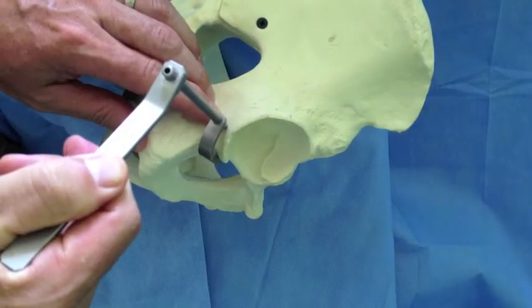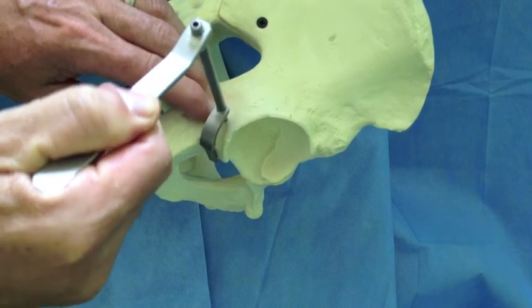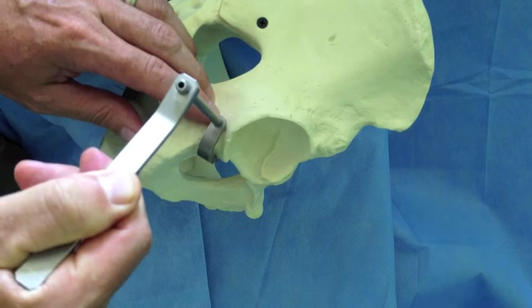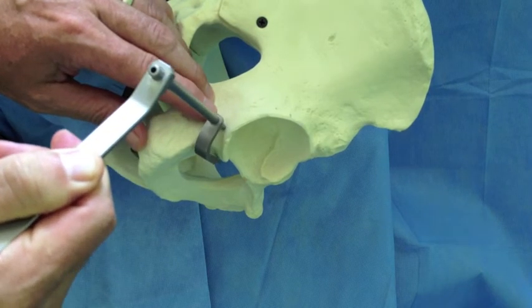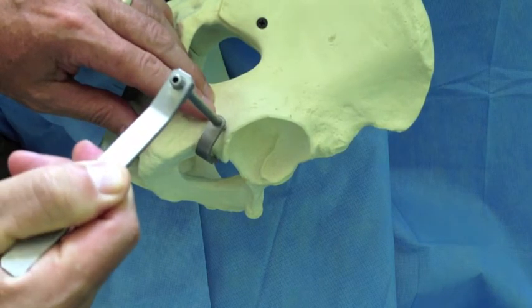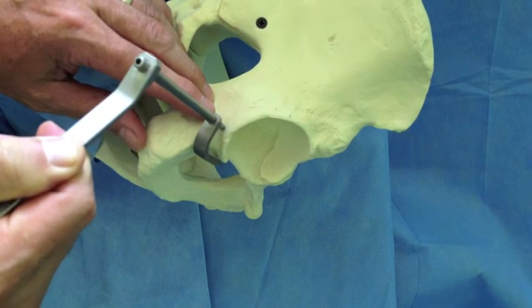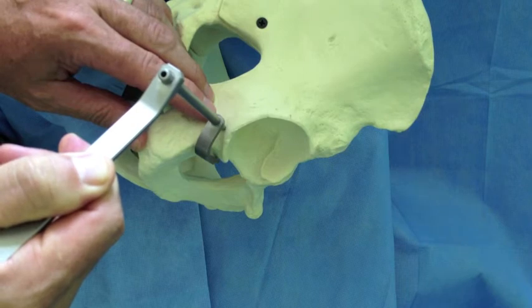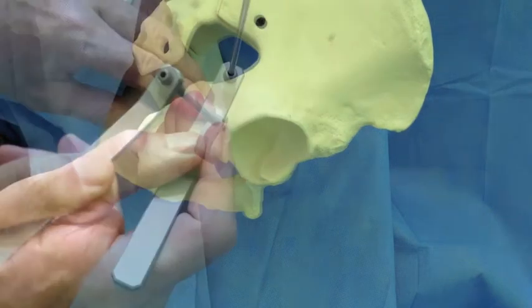You will see on this pelvis model that varying the coronal drill guide angle changes the location of the base point pin quite a bit, whereas varying the transaxial drill guide angle does not affect the location of the base point pin very much at all. This means that you should focus especially on the coronal drill guide angle primarily.